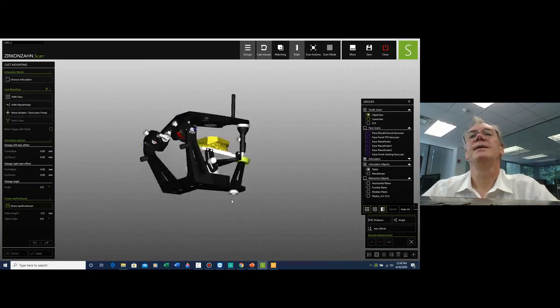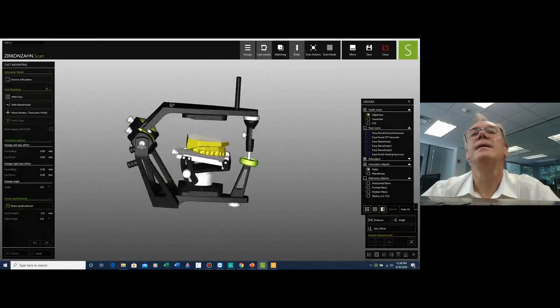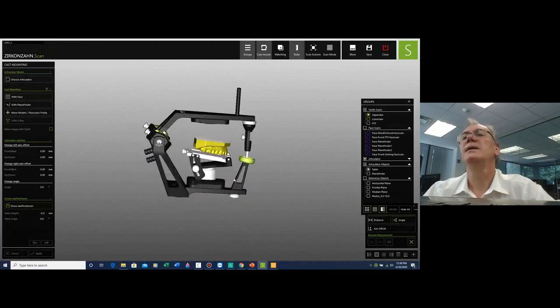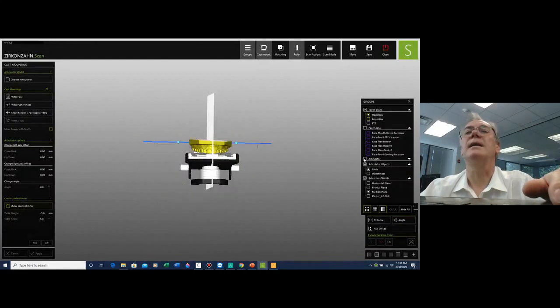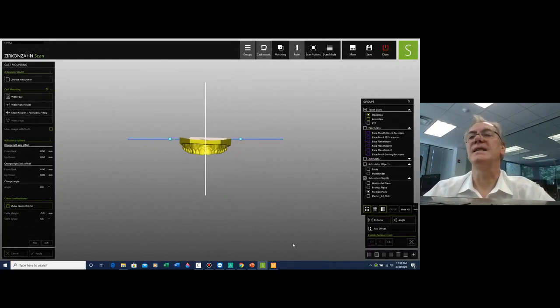So here we are. If I take the plane of occlusion of the patient and I take my median plane, I can actually see that it falls exactly in the middle of the articulator. Let's bring it here and let me just take the plate away. Voila. It falls exactly in the middle of the articulator and right in the middle of the midline seam.